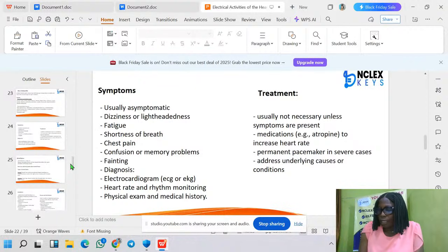Okay, the P wave is looking like a normal P wave, occupying 2 boxes, as I can see here. Then you look at the PR. Don't forget we have counted the pulse. Is it looking like a normal PR? You know why you should know this? Heart block, we also have bradycardia.